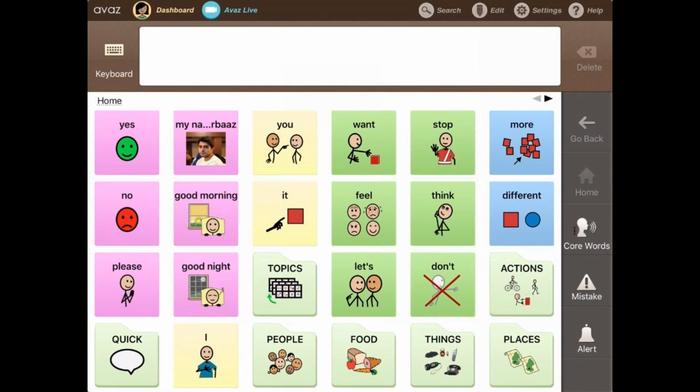So it doesn't really work as well as we would like it to, because this version of Avaz is made for the English-speaking audience, English-speaking communicators. But as I mentioned earlier, Avaz is available in other languages as well: English, Swedish, French, Danish, Sinhala, Vietnamese, and 6 Indian regional languages. And we're also introducing a Faroese version very soon. That should be out in a month.